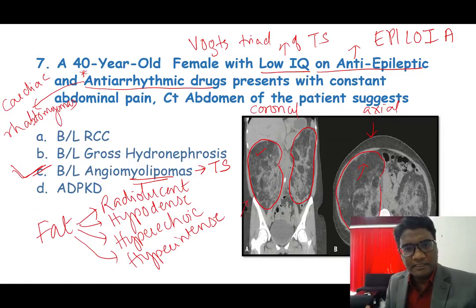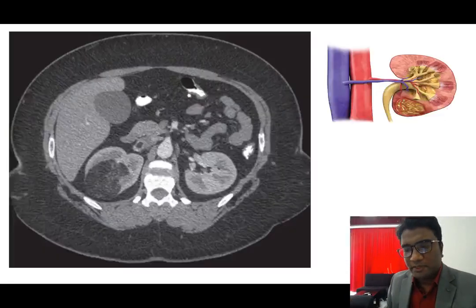A lot of other things that you learn: adenoma sebaceum, angiofibromas, bilateral angiomyolipoma, ash leaf macules in tuberous sclerosis. There is shagreen patch, SEGA, subependymal giant cell astrocytoma, subependymal calcifications, along with LAM in the lungs, lymphangioleiomyomatosis in the lungs. All of those things are features of tuberous sclerosis. I hope you understood the clinical scenario and how to interpret it with the radiological image. So that is about tuberous sclerosis.